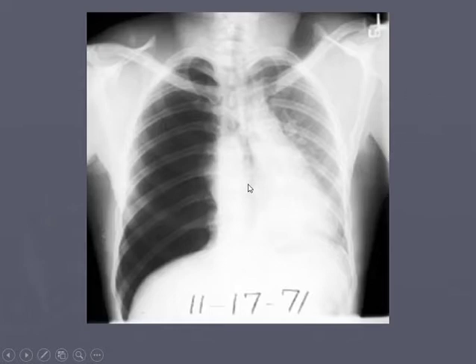Here's another example. You take a first look at it, but again, going through A, B, C, D, E, F: airway, deviated to the left. Bones, 1, 2, 3, 4, 5, 6, 7, 8, 9. And it looks like we could even see a 10th or 11th rib down there. So this one, we're seeing a lot more bones on this side than over here. Cardiac shadow, I can't really see it. I can't even see the pulmonary arteries. So that should raise red flags.